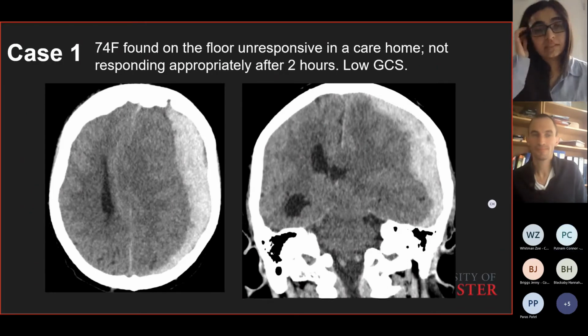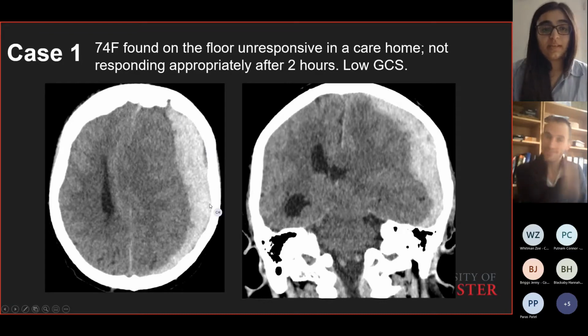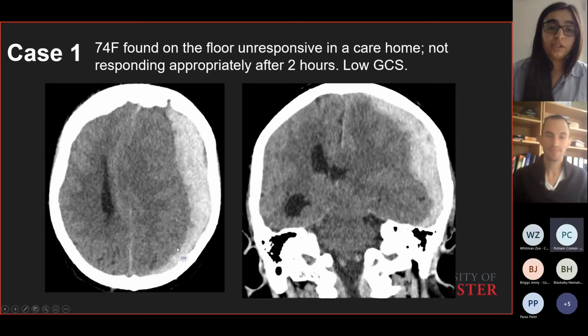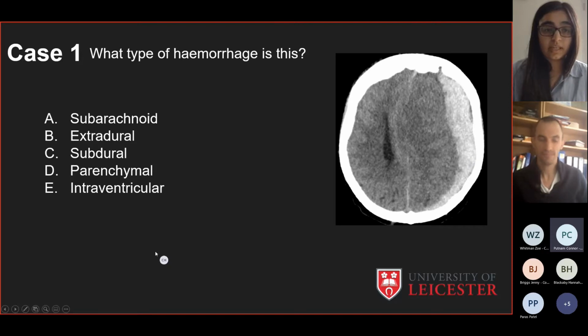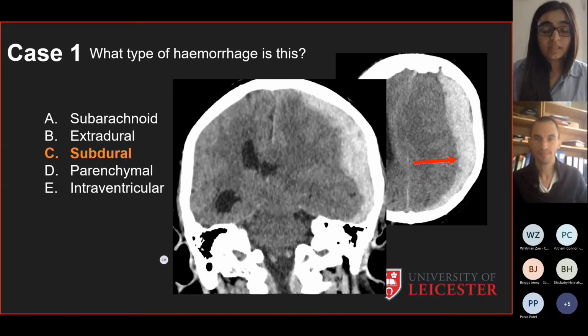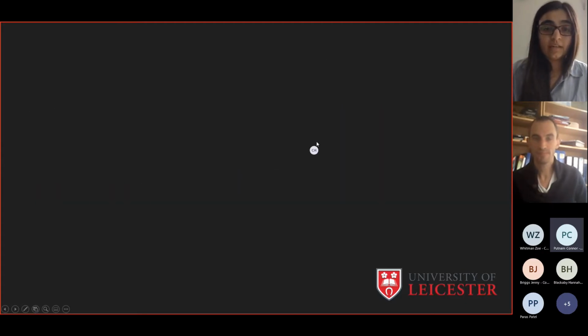Subdural. Fantastic, yes. So all of this that we're seeing, collection, hyperdense, it's completely white compared to the actual grey matter next to it, which is the brain, and that's a hemorrhage collection, which is subdural. I meant to show you this one, but yeah, you've got the correct answer. So also, can you tell me what else is happening on this picture?